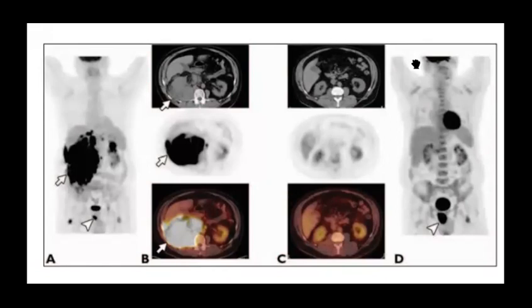So after he took this treatment, do you remember when I told you that in the bone marrow he has something called hyperplasia after chemotherapy? Can you recognize it easily? Look in the spine and the pelvis. You can see this is expected, bone marrow hyperplasia, right? So there is no metastasis here or no infiltration. Perfect.